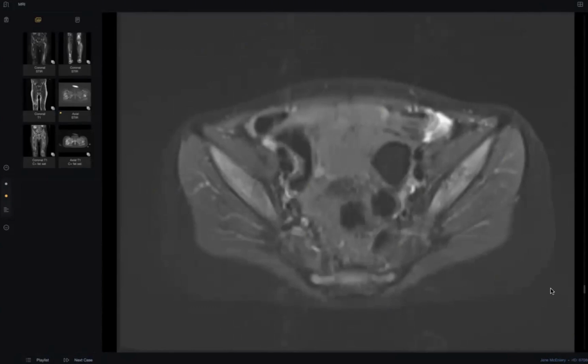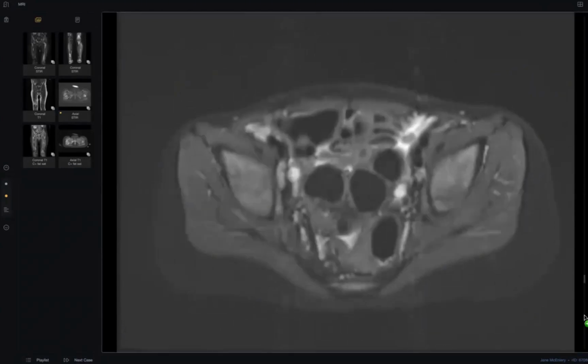Differential again? Sir, leukemia, lymphoma, and... Okay, Dr. Omer, my advice to you: there is a clue of the primary in the images, in the film edge. Okay, sir. I tried to examine the kidneys. I would examine them once again. Okay, wait. And the scrotum as well.